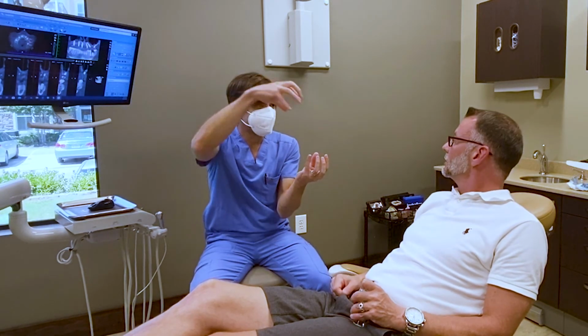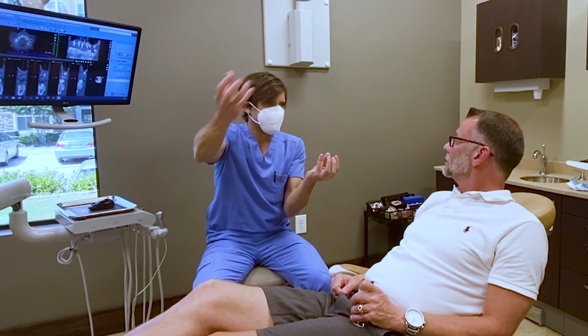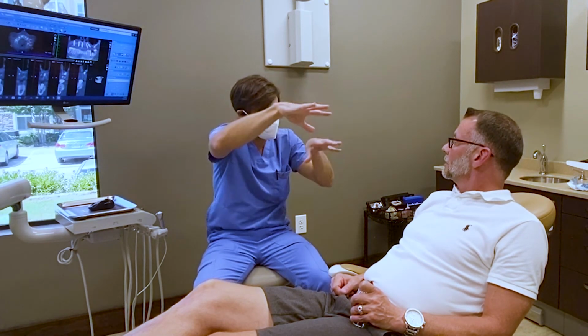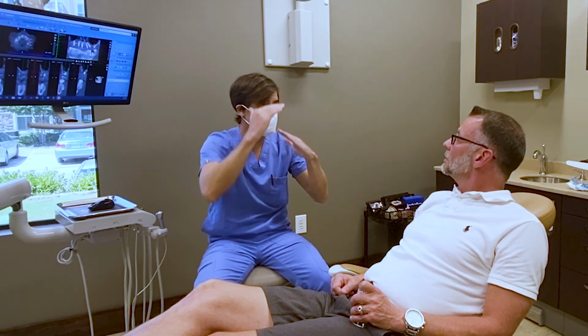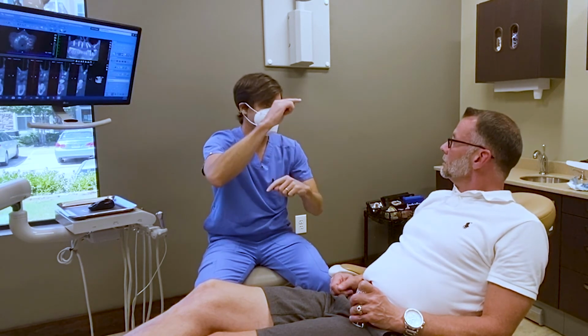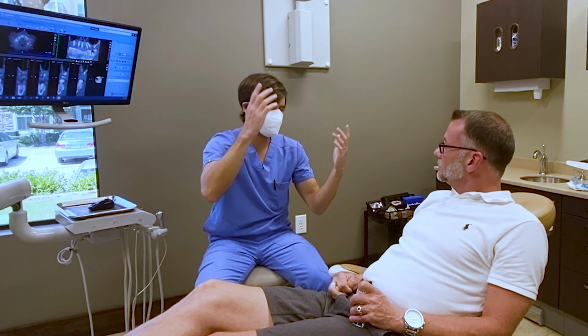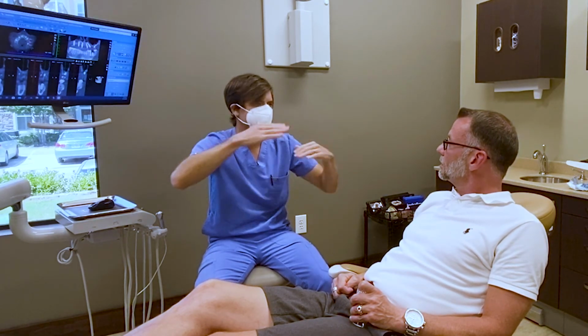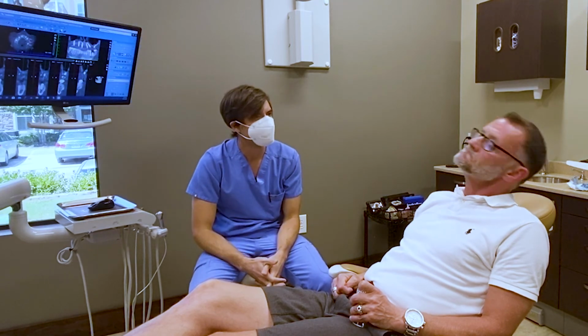Yes, with the multi-unit, you're converting the female connection into a male connection. That's the best way to put it. So now you work with a prosthetic as a female, so it's easier. There's no huge connection. It's just a very shallow connection. So instead of 7 millimeters going inside the implant, it's just a couple of millimeters, and it's easy to see because it's almost flat against flat. Perfect.